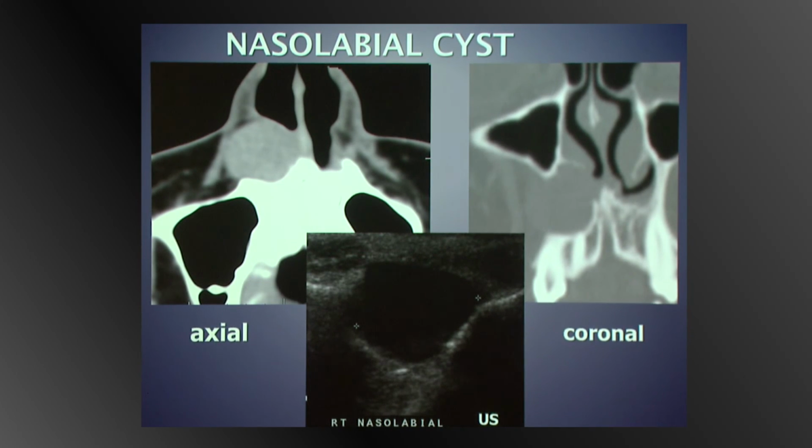The nasolabial cyst is a soft tissue fissural cyst between the median and lateral maxillary processes. It often presents to GPs rather than to dentists because there's no dental connotations apart from osseous scalloping. And they may be unilateral, but I've seen them bilateral as well. This one's of proteinaceous content, cystic on ultrasound, and it's causing some osseous scalloping. The teeth are vital.